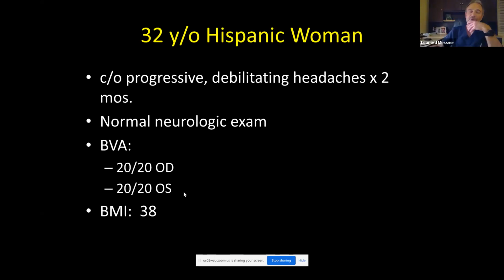Yeah, that's a great point, Greg. I could not agree with you more. And certainly for your glaucoma patients, where you're looking at the morphology of the optic nerve, there again, you would expect to see that Bruch's membrane complex, or that Bruch's membrane line, going down or going posteriorly as opposed to going inward. Great point. So this is a case of a 32-year-old woman with idiopathic intracranial hypertension.